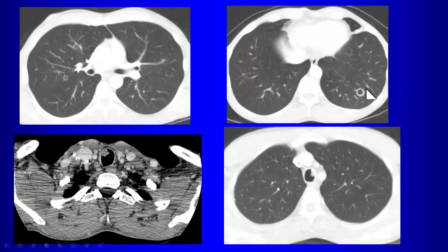I wouldn't call it thick, but we do have a cyst here. Is that the only lesion in the lung parenchyma? Yeah, we also have lesions in the airway. So this has more than one lesion, and then there's also another thin-walled lesion here.